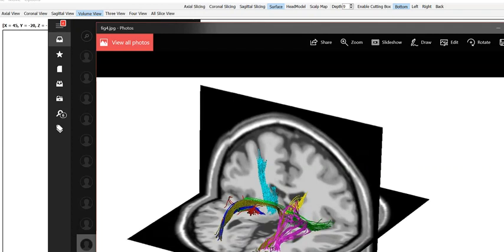And then we'll begin to add diffusion tensor imaging to the NeuroNavigator as well, with controls that, again, will be linked to the networks and symptoms, but that will provide the undergird, sort of the infrastructure of the EEG, because we'll be able to then see the current density and electrical potential from the scalp surface in a transparent skull that we can cut through, and also then see the brain inside the skull, and then the connections between the 88 Brodmann areas.